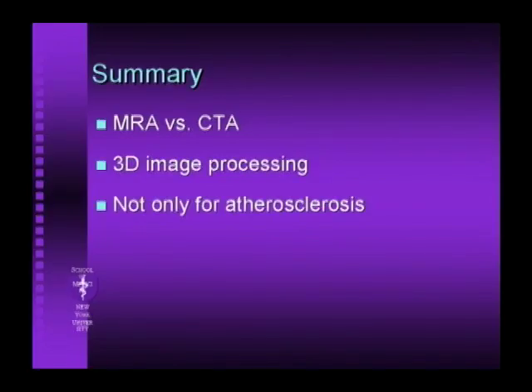So just to summarize, MRA versus CTA, your call. Whichever, as you can see from the images, they both work well. They both demonstrate what you need to show. But it's whatever is easier and more convenient for your patients. Obviously, there's a radiation effect as well.